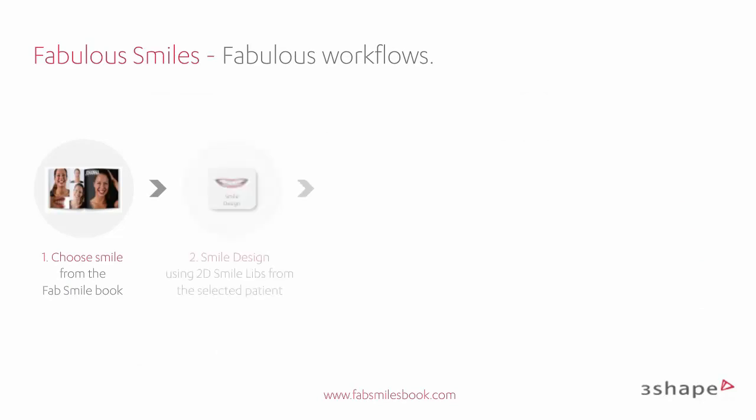Then the next step is that you can go into Smile Design, where there are 2D libraries. I will show you in 2 seconds what Smile Design is. The next step is then that you can send the Smile Design to the lab.